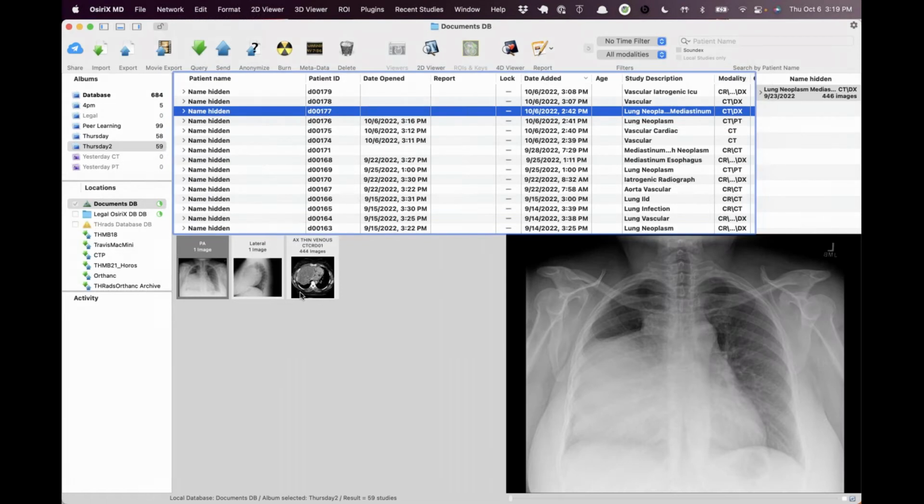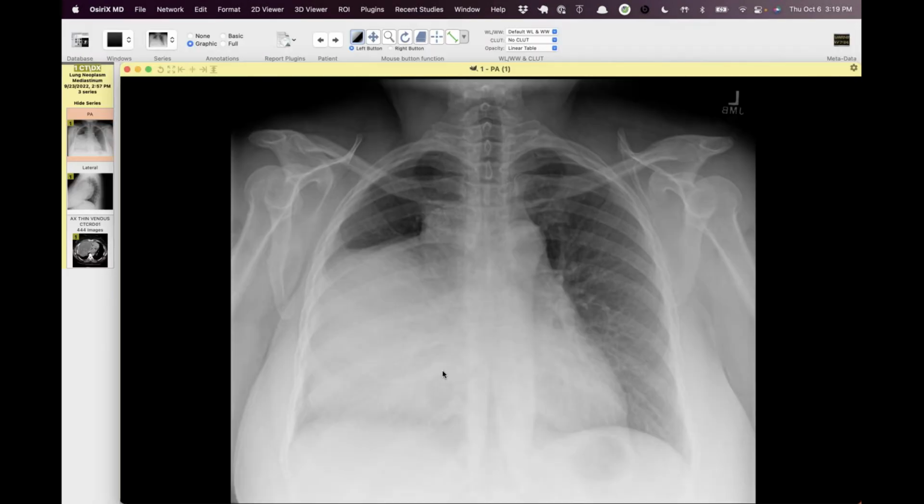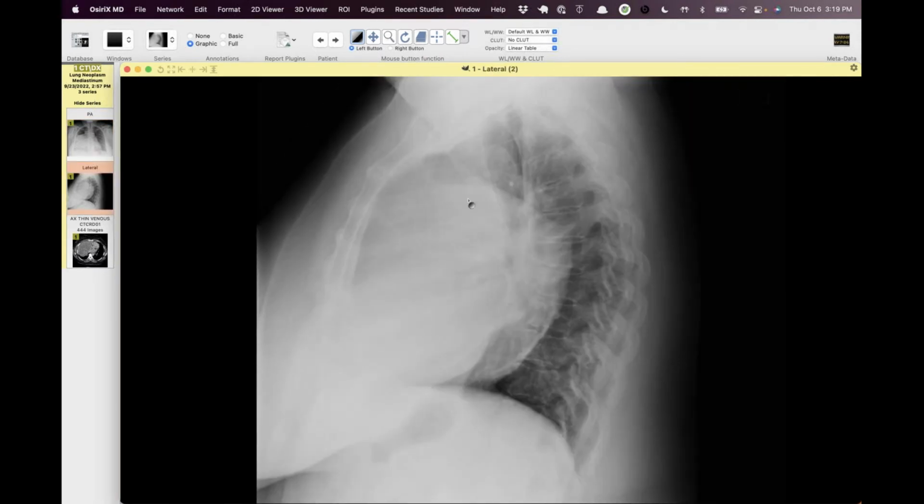All right. Well, this one, the radiograph is not a dilemma here. This is a patient in their 40s who came in with a chronic cough, to the point where they were having coughing episodes that were basically inducing vomiting. They got the radiograph, and the easiest thing to see is this huge mass along the right side of the mediastinum, obscuring the right heart border and occupying much of the right hemithorax.